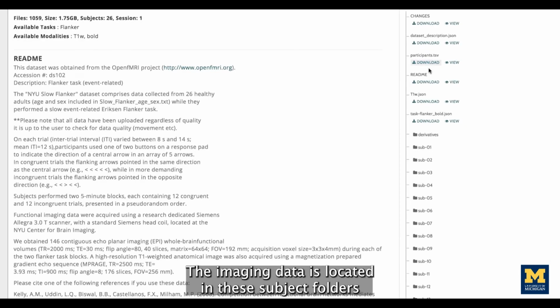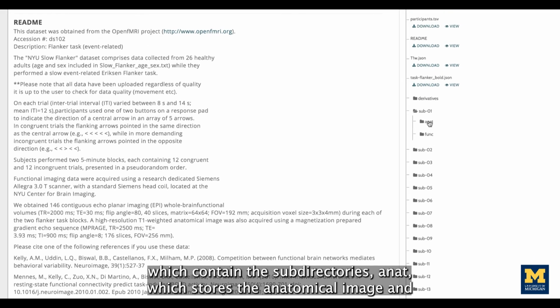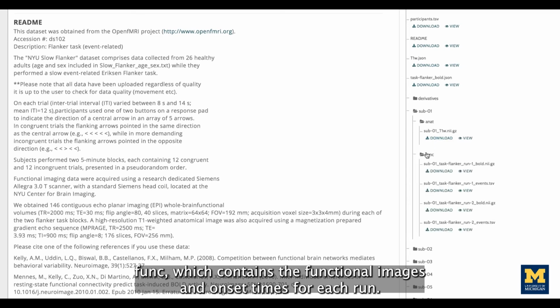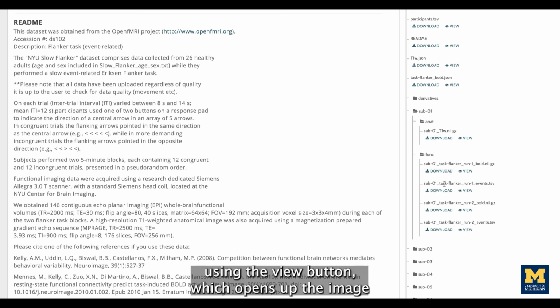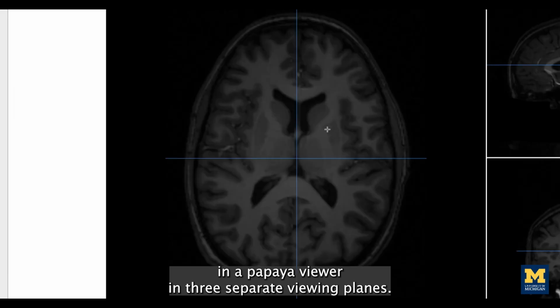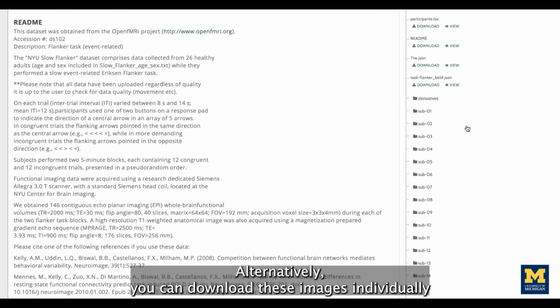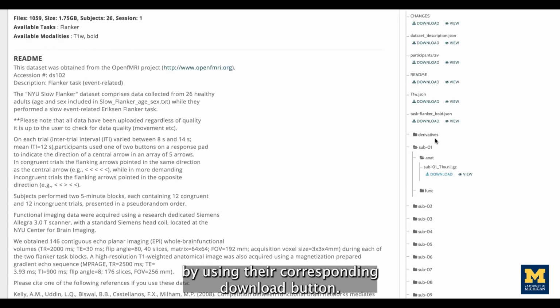The imaging data is located in the subject folders, which contain the subdirectories ANAT, which stores the anatomical image, and func, which contains the functional images and onset times for each run. Just like with the behavioral data, you can look at these images individually using the View button, which opens up the image in a Papaya viewer in 3 separate viewing planes. Alternatively, you can download these images individually by using their corresponding Download button.